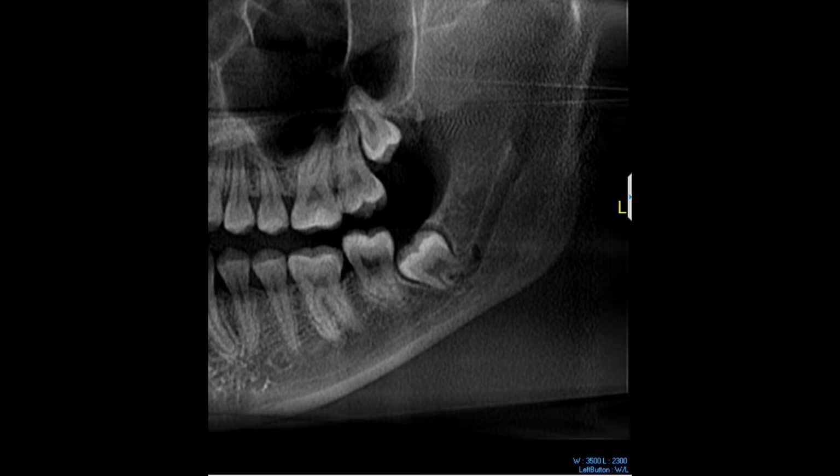And I'm not talking about incomplete apexification. I think that's the proper term. Having to go back in my memory banks there. I'm not talking about open-ended apex here. I'm talking about a patient that has pretty much well-developed third molars, but as you approach the apical portion, the root becomes darkened. That's indicative of involving the nerve, and we want to be aware of that, especially when we're talking about removing these teeth.